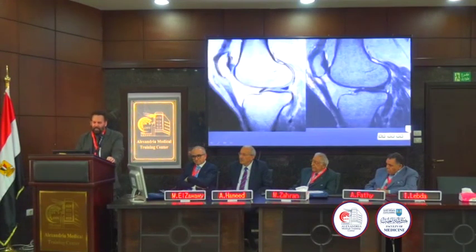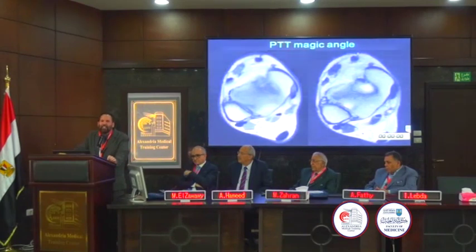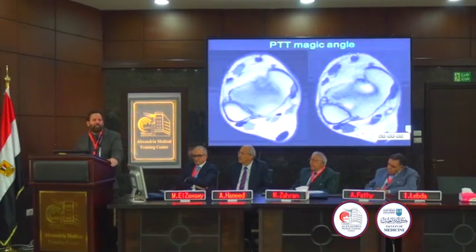Here's a patient with severe rotator cuff tendinopathy and a big, thick tendon. We'll talk about signal in a second. Jumper's knee, big, thick tendon, some signal, but mostly abnormal size and shape. Now, another thing you can get in tendons is not internal signal, but loss of the magic angle. So the magic angle is something that you'll see on images with short TEs, usually in the 20s. And so here's the posterior tibial tendon, magic angle goes away with a longer TE.